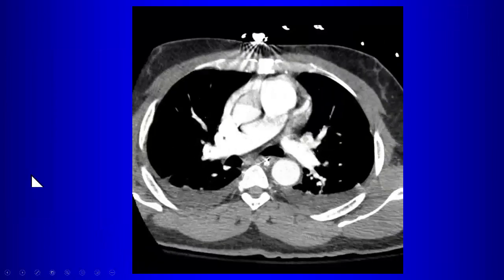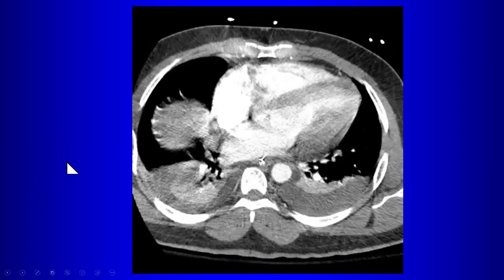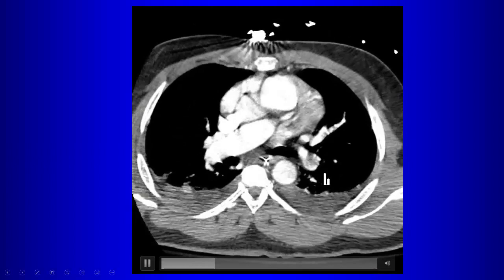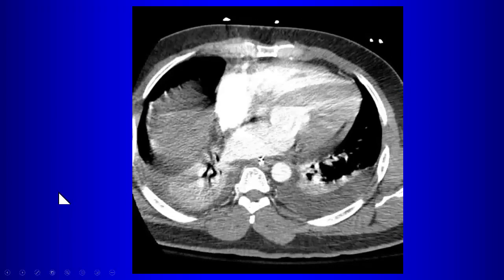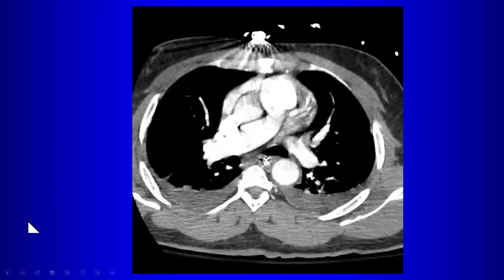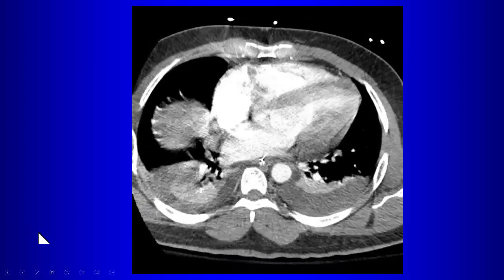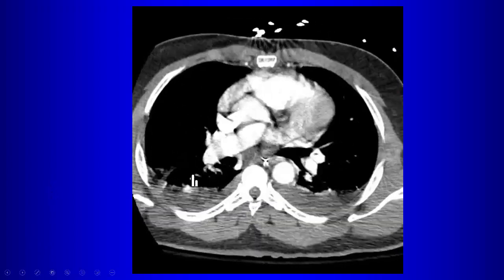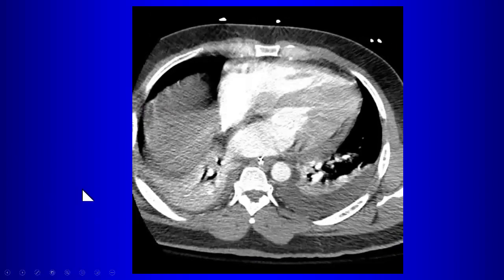And then looking at these pulmonary arteries bilaterally, it looks like in the interlobar vessels here, there are filling defects. Is that PE or is that something else? See? It's another fake out. So it's a fake out from what? First of all, why do you suspect it's a fake out and not a PE? There's the PEs that are right at the branching point of the vessels.